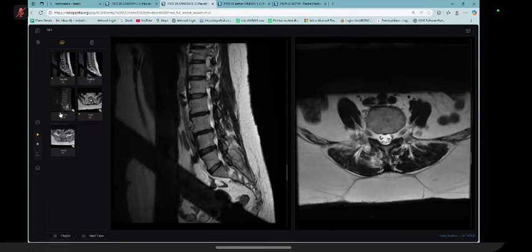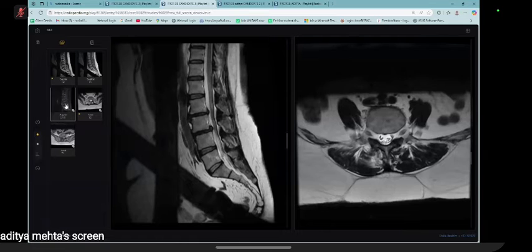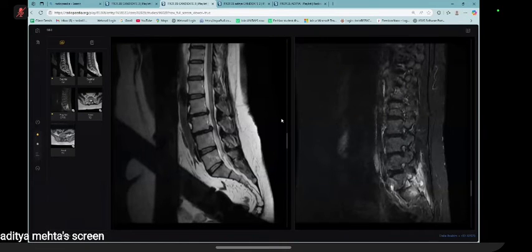So let's go with how to see MRI. We are starting with the basics. Whenever MRI is given to you in UK, how students are learning is they have been taught that the first sequence should be this, the second sequence should be that. If you have seen T2 first, you have to check the STIR second to look out for any important safety finding. Safety findings here are two, always, in case of the spine. First is cauda equina, as you said, another is infection.